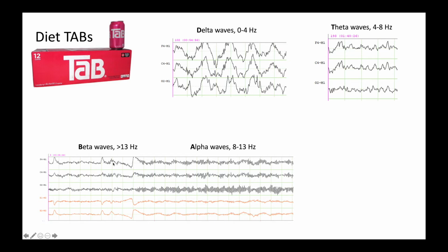Beta waves are often, I think, the toughest to see as discrete waves because this is what our brain looks like when we're awake with our eyes open. So we have these really fast waves and a lot of just noise, as all these little neural vectors, these electrical vectors, sort of cancel each other out. So you've got almost a much flatter line than the other waves that, if you look carefully, has very high frequencies in here.